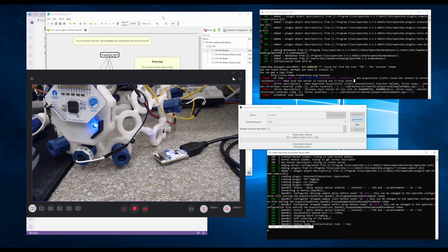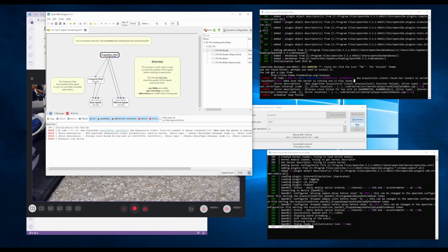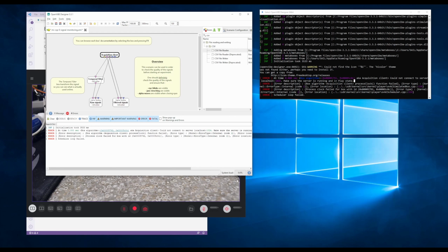And still, if I play here, so now it's playing, but nothing's showing up because we haven't clicked play here. So stop that. Yes. Play. And it crashed. It's okay. Don't panic. Happens all the time.